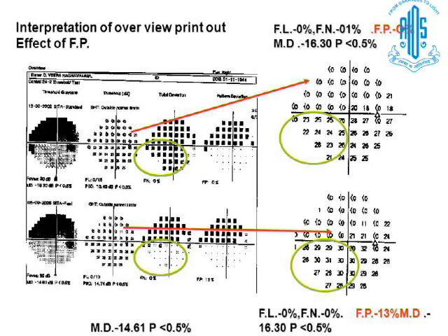So this is responsible. Actually in these things, the patient didn't improve. This is the correct field. This disappeared because of the false positives. So for interpretation of the progression, you have to consider the fixation, reliability data, the size of the pupil, refractive correction, pupil size, then foveal sensitivity. All these things should be taken into consideration.